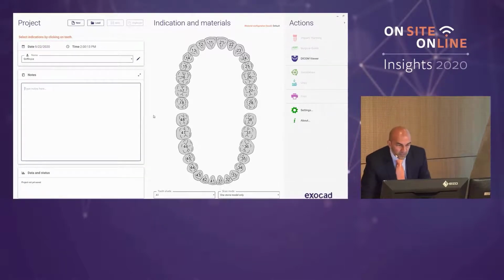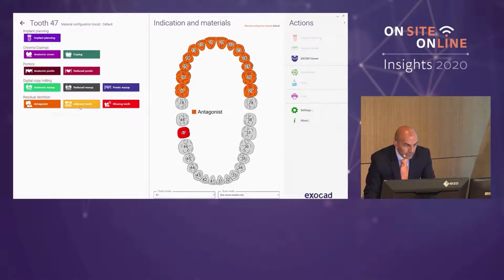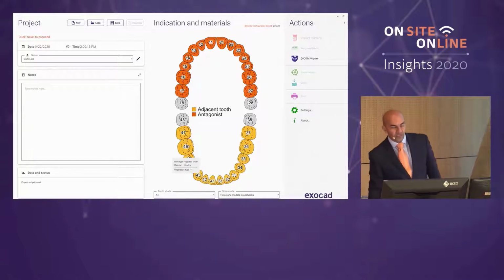It's about practical and predictable implant planning. Okay. So again, I'm going to just highlight which data set that we have here. And what I'm going to do is say that our upper jaw is our antagonist. Click on OK. If I hold the Shift button, I can mark everything in the arch really quickly. In the lower jaw, again, we've got 7 to 7. These are our adjacent teeth. So again, click on the opposing side, the adjacent side, 7 to 7. And our working tooth here is the 4-6.